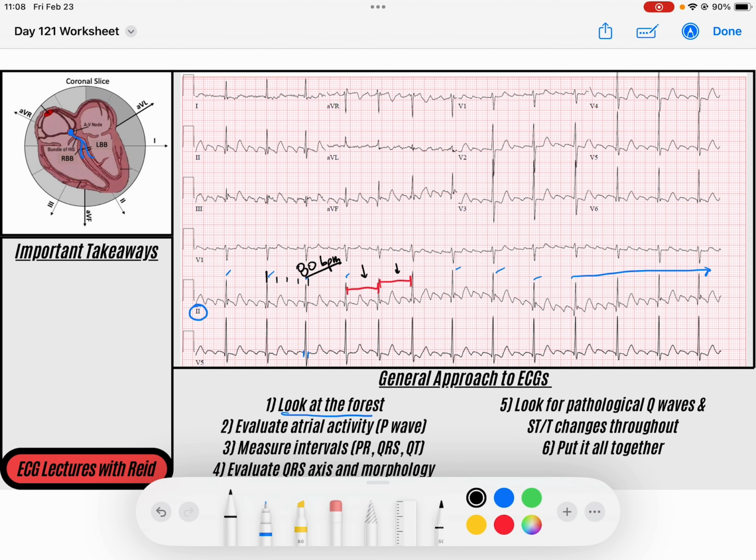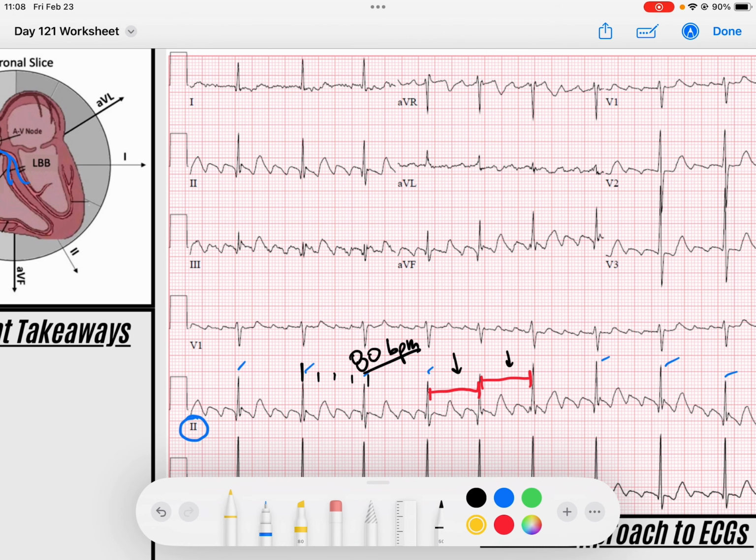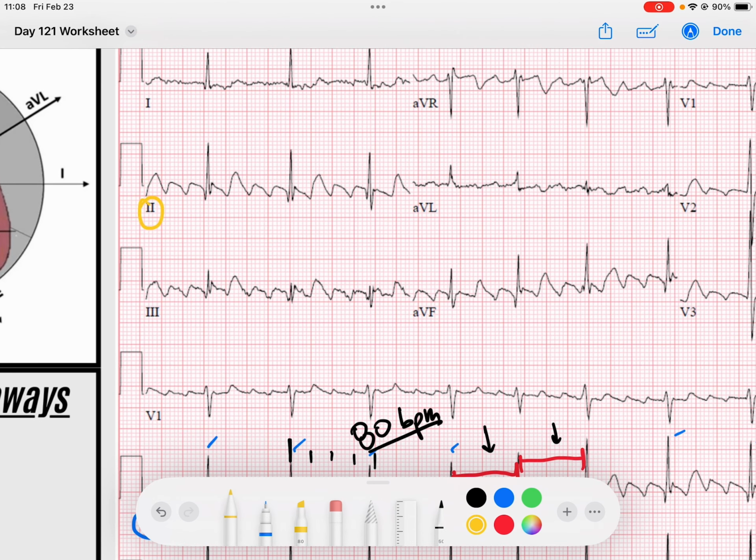And I look for what my atrial activity is, what could explain what's going on. I think this probably already jumps out at you guys, right? Look at lead 2. Look at what we see. We've got this beautiful atrial background activity going on, right? What does that make you think? That makes you think atrial flutter. But that's just a thought. Let's make sure this is atrial flutter.